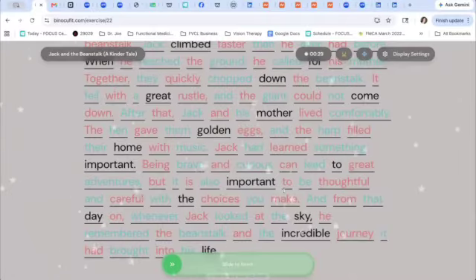I've done this where I uploaded a list of sight words for a first grader who really wasn't fluent in reading yet, and we were just working through looking at the words and seeing the letters and that type of thing. But it was really helpful to be able to customize that, and I just cut and pasted that into that first screen that I showed you, and we were able to work like that.